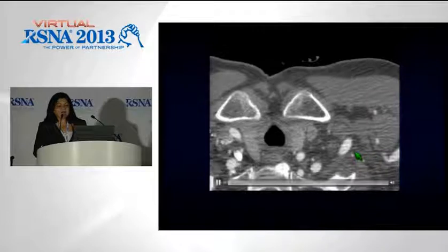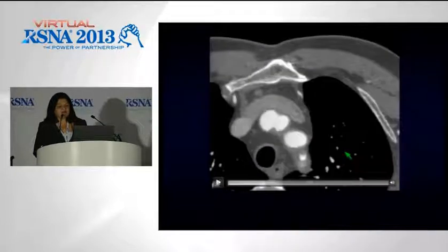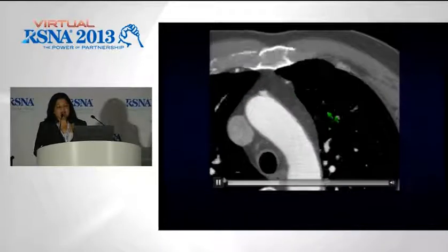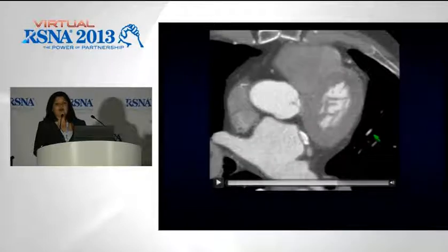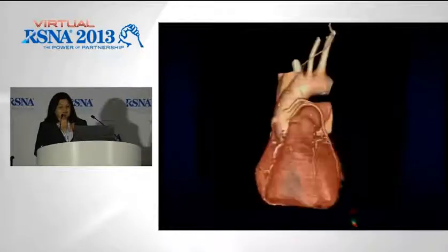So keeping that in mind, when we look at this patient and his internal mammary arteries going down, we see that the right internal mammary artery is in its normal location. The left has been dissected away from the parasternal region down into the mediastinum, and this has been harvested to anastomose to the distal LAD. So that way you know whether they have used the internal mammary artery for bypass grafts. This patient also has a saphenous venous graft.